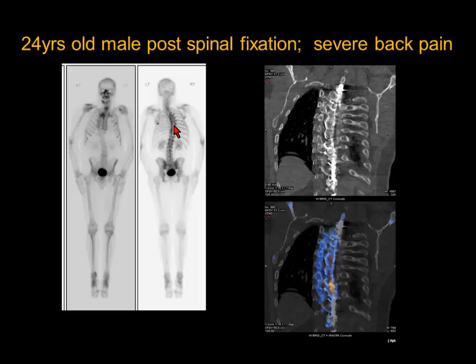As you go down, it's still fine. Now again, the angle changes here. Then again, there is flexion at this point. So this is the point of most pressure, so you've got more intense degenerative change. This is just hypothetical, looking at the two planar images. And again, if you look at it, the convexity changes here. You've got this facetal arthropathy, and then probably you've got spinous uptake.